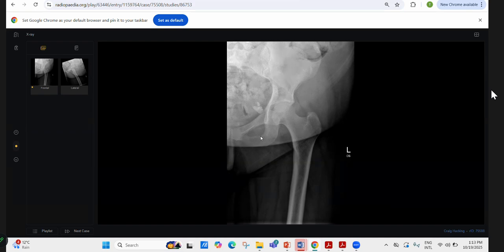Can I say my opinion? Yes. This is a tooth-like calcification in the pelvis. So if the patient is having pain, this can be torsion due to dermoid or ruptured dermoid. So this patient needs CT for evaluation of this abnormality. Yeah, perfect. So this is the dermoid case.